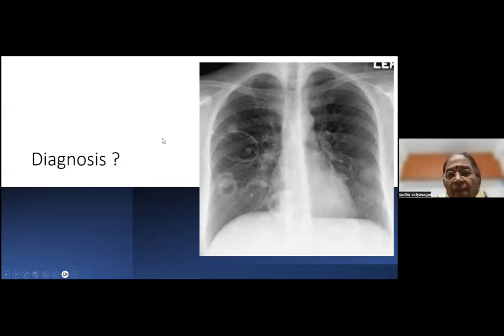Okay, what is that? We are nearing the end of the respiratory. Once I finish this, I'm going to stop. So what is that? Thin-walled cavity. Cavity or cavities? There are multiple, isn't it? There's one here, there's one here, there's one here. Okay, there's an attempt here. God knows what this is, isn't it? Okay, so there are multiple and these could be a hydatid or single one.